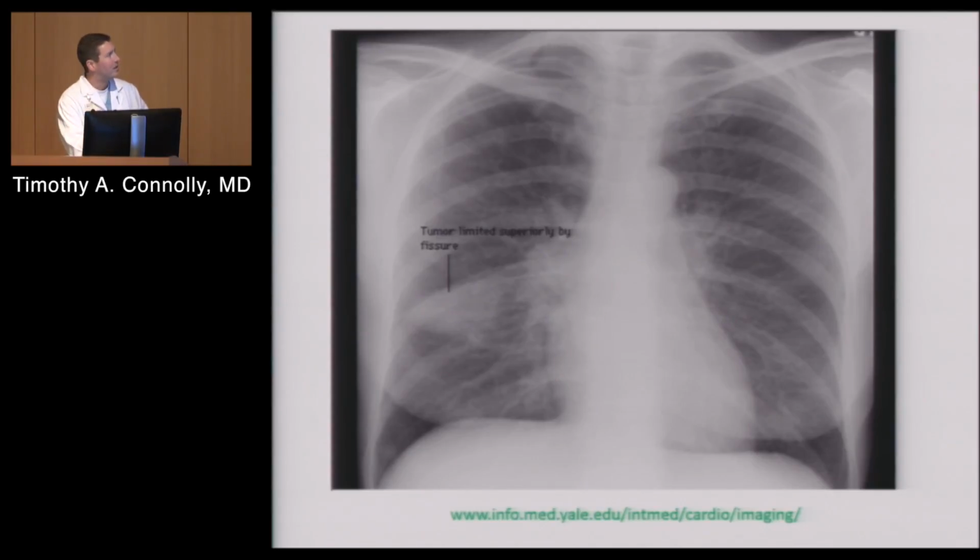The reality is, it's easy when we have this wonderful little cheat sheet here telling us what it is, that it's actually something sitting with the fissure on top of it. This could very well be fluid in the fissure. It usually has a slightly different appearance, but the bottom line is this would be something you'd have to get a CT scan to get a better view on.